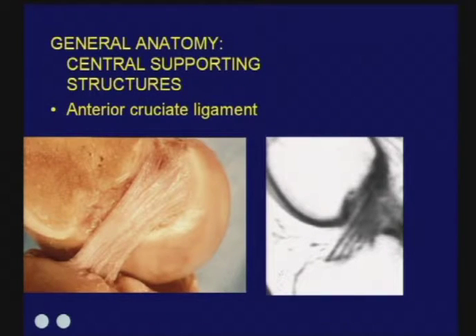You all know the way we quickly assess whether or not the anterior cruciate ligament is normal or abnormal. We turn to the sagittal image. We find the roof of that intercondylar notch. We find the anterior surface of that anteromedial bundle. And if that line of the cruciate ligament is parallel to or steeper than that of the roof of the intercondylar notch, we generally put a check mark that the anterior cruciate ligament looks pretty good.